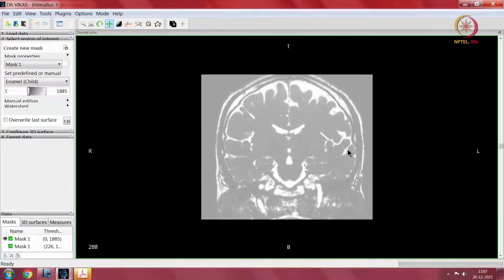Here again you can see this continuum. If we trace, this is the general subarachnoid space. The general subarachnoid space goes between the frontal lobe and the temporal lobe and then goes deep, and this forms the insula. Same thing here, it goes from the outside, creeps in between the temporal lobe and the frontal lobe, and this forms the insula. So, insular cortex.